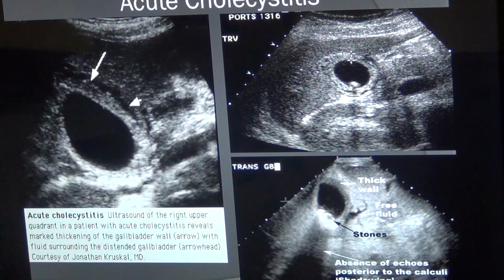But if you measure the gallbladder wall in AP view, anteroposterior, then you will see the gallbladder wall is thicker, edematous, has hypercongestion with the blood vessels, and pericholecystic fluid. Look at here, the pericholecystic fluid around it. And this is gallbladder wall thickening.